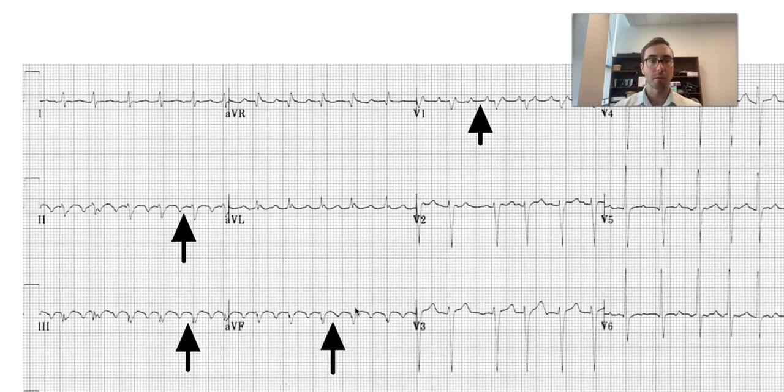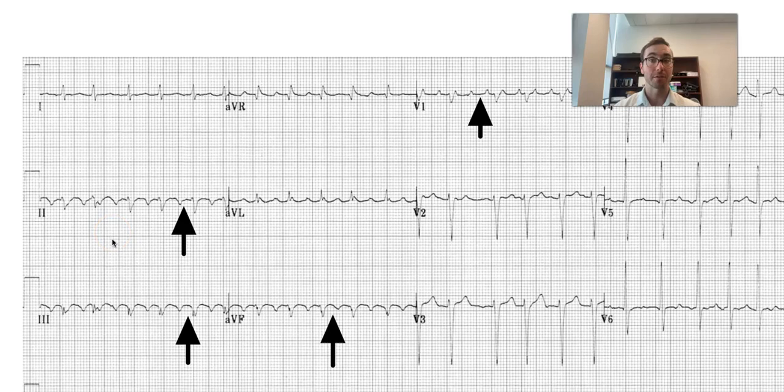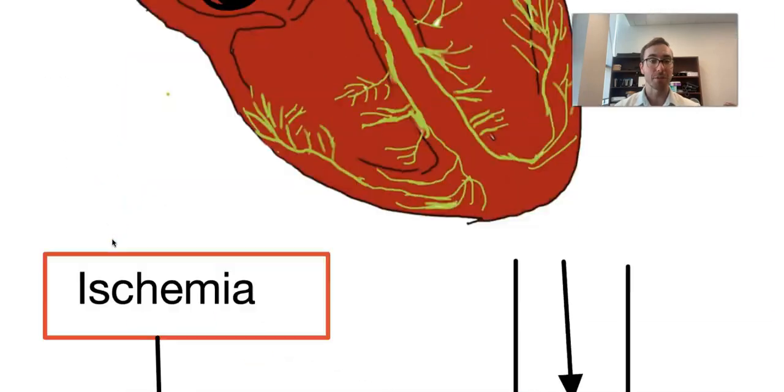And if we look at the 12-lead, you can tell and distinguish atrial flutter by looking at the inferior leads, especially if the impulses are going in a counterclockwise fashion. You usually have inverted sawtooth pattern in the inferior leads, and if you look at V1, you'll have an upright P wave. That is highly indicative of atrial flutter, and again, it's the impulses or reentry current is traveling in a counterclockwise fashion. And again, these QRS segments are regular. So that's kind of the key differences.